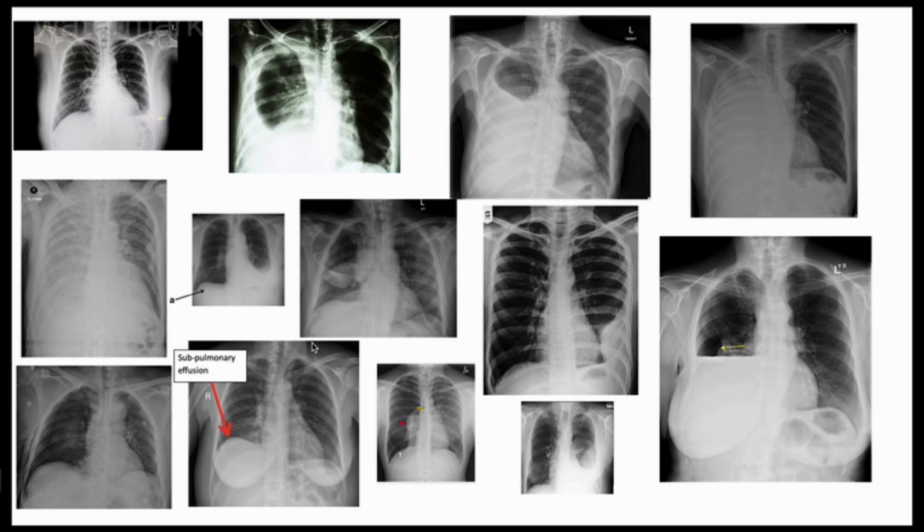Like in quite a variety of these. Commonest is the pleural effusion, and the pleural effusion is seen by this rather lamellar hyperintensity or increase in density along the chest wall, and of course we see that there is that meniscus sign.